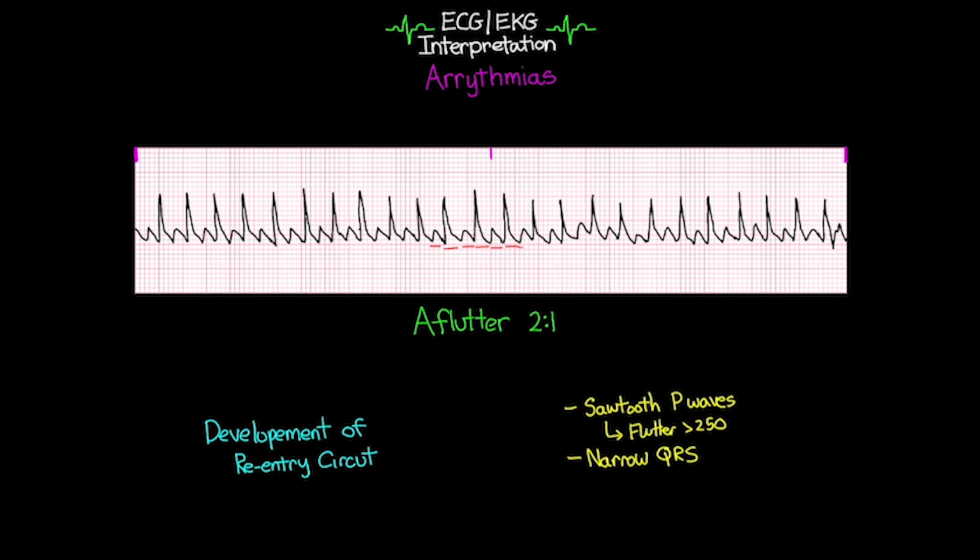Now, sometimes you're going to be able to distinguish this sawtooth appearance in that indistinguishable T wave, P wave, but sometimes you're not, and it's really not going to be distinguishable from an SVT. It may require further investigation with either an EKG or even using something like adenosine to slow things down for a bit so you can see what's underlying. Otherwise, the same causes apply as when we're looking at our normal A-flutter, but I did want to show you this so that you can see an example and know that it may not actually be SVT.